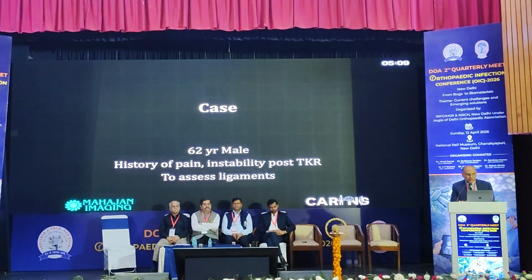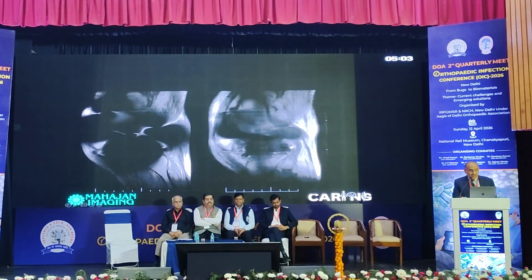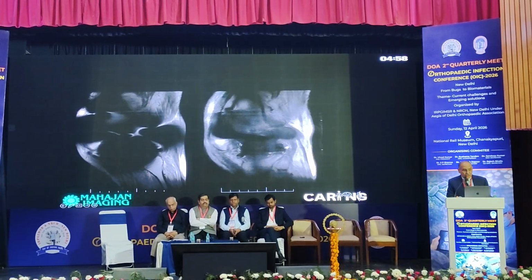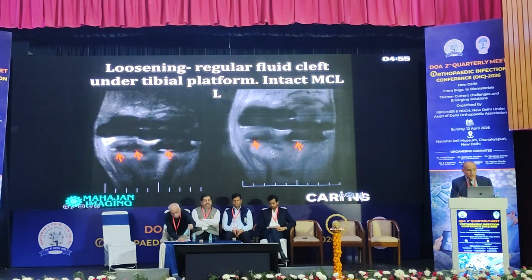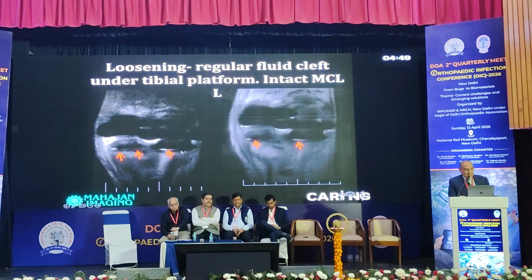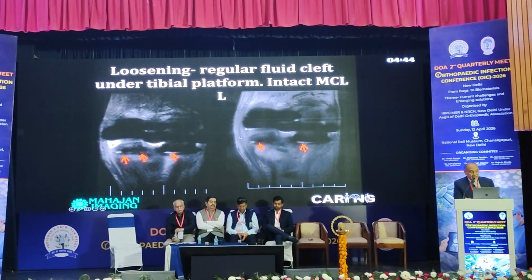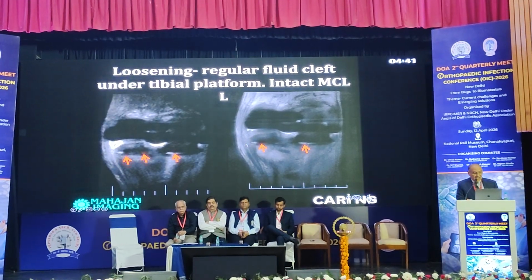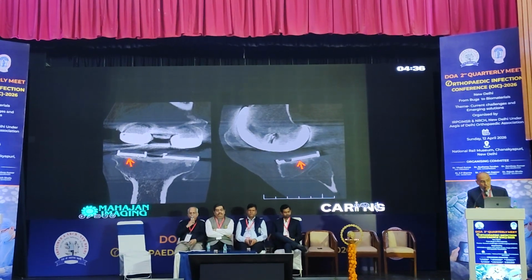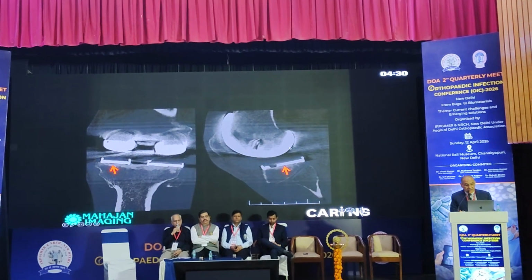Another 62-year-old, history of pain, instability post-TKR. They wanted to look at the ligaments. And this is MARS, that is MAVRIC, and you do see some changes here. But what you see on the coronal is these fluid clefts that we see under the tibial platform. And of course, we can see that the medial collateral ligament is intact. So this was aseptic loosening in this case, for which we also did a CT, and that could be seen here as well.